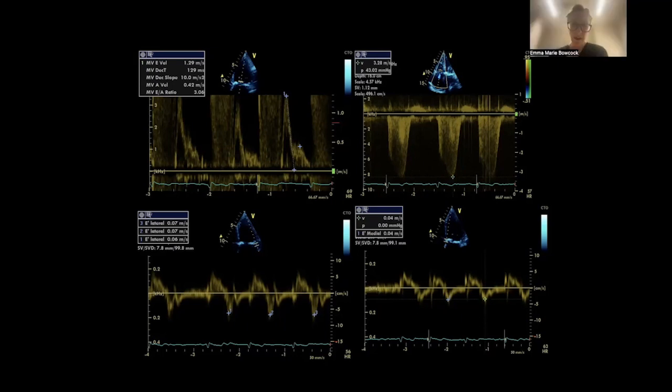Yeah, nice, Ben. The only thing I would say is that I'm not sure this is an A wave, because I think she's not in a clear sinus rhythm. Yeah, I guess I just looked at the top left box. I didn't look at where that cursor would put.